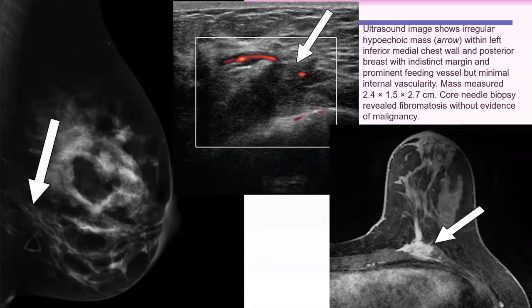Being at these locations, having the same appearance of stromal fibrosis, however, it is infiltrating the pectoralis muscle. This is characterizing which type of lesions? Malignant lesions. We are talking about 3 types of lesion: focal fibrosis, fibromatosis, and diabetic mastopathy.